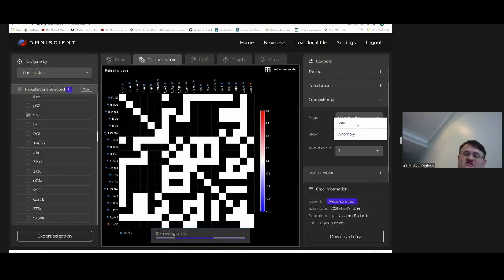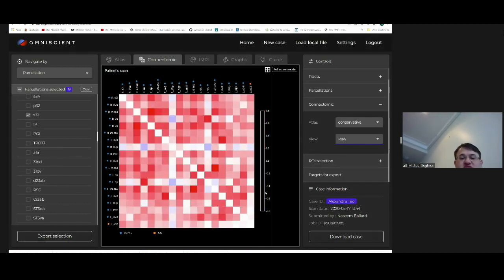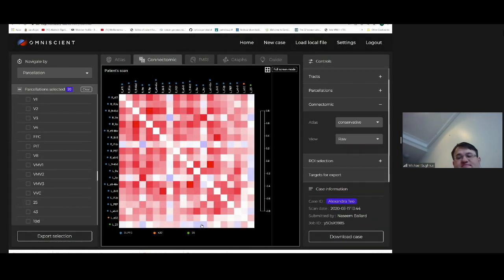let's see, subcallosal 32 is 25. You see that it's very simple to basically look at how this is anti-correlated with the DLPFC. And some people have recommended that looking at the subcallosal cingulate, specifically area 25, is one methodology for targeting this. So it's possible. Oh, there we go. There's area 25 right there. So again, this is an infinitely flexible platform.